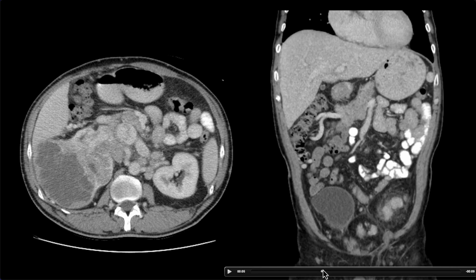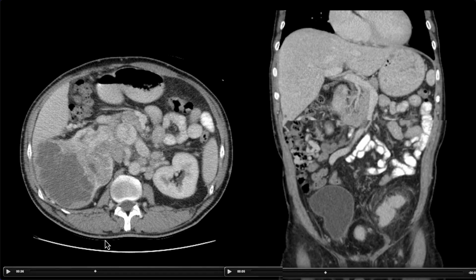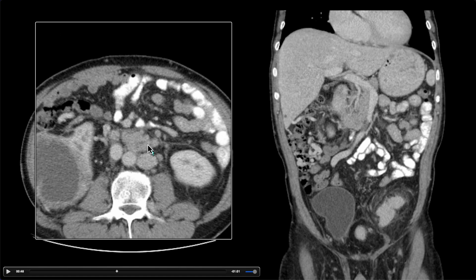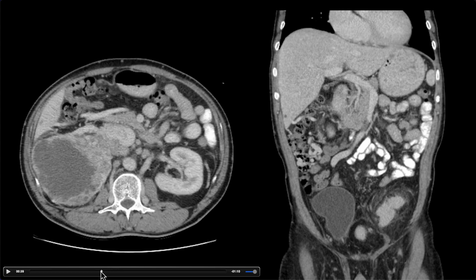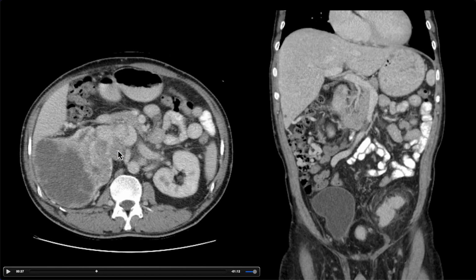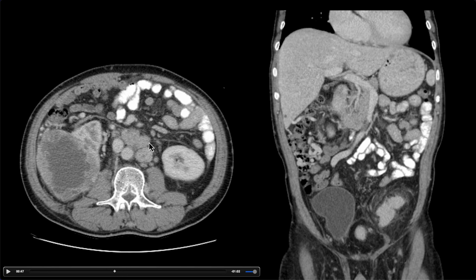In addition to that, we have some unusual findings in the pelvis. I don't know if you were distracted by them or not, but here they are. So the urinary bladder is displaced by this big, strange-looking nodal mass. And then on our way down, there's this bulkier than expected retroperitoneal adenopathy, which wouldn't commonly be seen even in the setting of a large renal cell carcinoma. We have a couple of these hilar lymph nodes, down here and maybe along the periaortic region immediately adjacent to the tumor, but heading inferiorly, seeing these bulky lymph nodes is not really a typical feature of renal cell carcinoma.